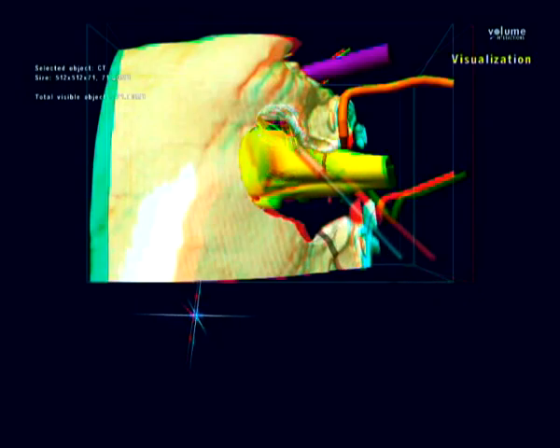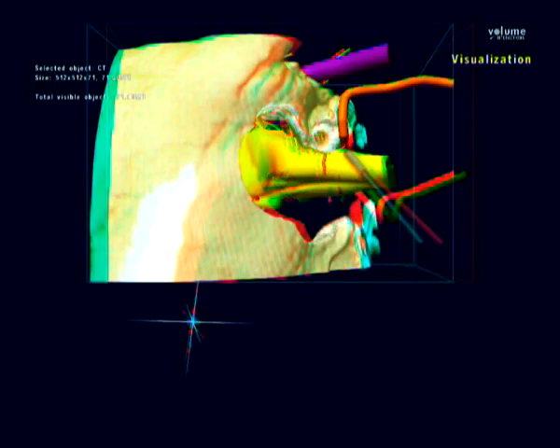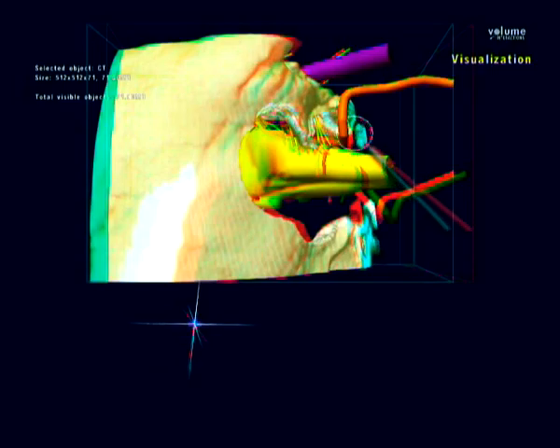Here in a far lateral approach, the condyle is left intact. The jugular tubercle is drilled above the condyle. The condyle is now partially drilled in a partial transcondylar approach to expose the hypoglossal nerve rootlets in the hypoglossal canal.